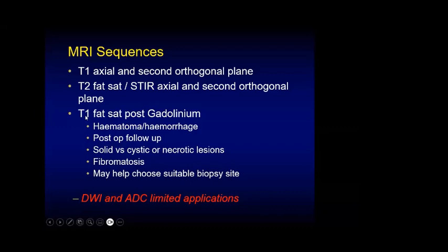The contrast-enhanced T1 fat-saturated sequence. As I mentioned, I worked in different centers, and different centers have different approaches to contrast-enhanced tumor imaging.